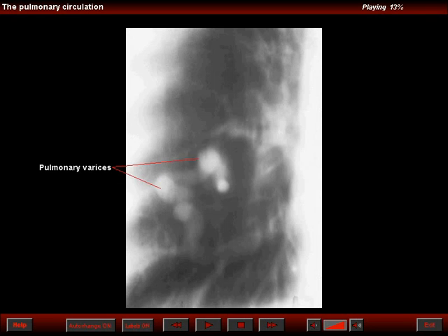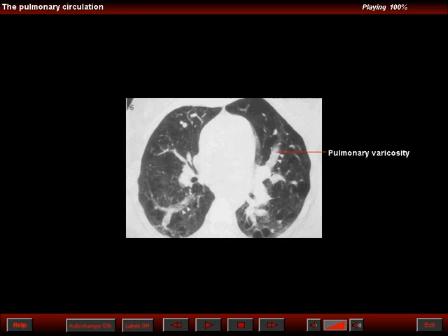Standard tomography revealed vascular structures. At first glance, they may mimic pulmonary artery aneurysms or AV malformations. CT examinations are usually very revealing of these vascular abnormalities. They can be used for the diagnosis of aneurysms, AV malformations, as well as pulmonary varicosities.